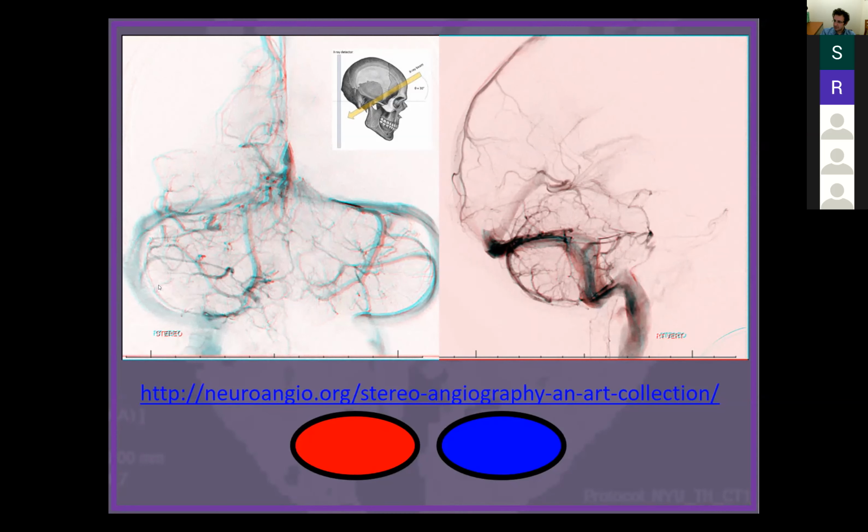Okay, so you could look at it that way. In the posterior group, of course, this is a vermian vein, the superior vermian vein, which in this case is draining towards the torcular region. These are some inferior cerebellar veins. You can see them here and here, these two, and those are coming up also posteriorly.